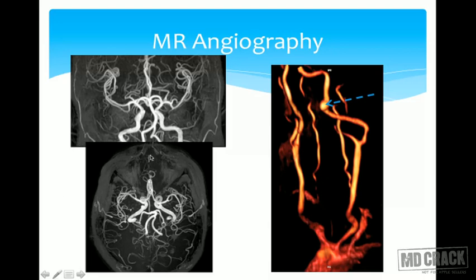Now these images that I'm showing you over here are basically MR angiography images, which obviously do not require any injection of contrast. So these are beautiful images that you can see over here of the vertebral arteries.